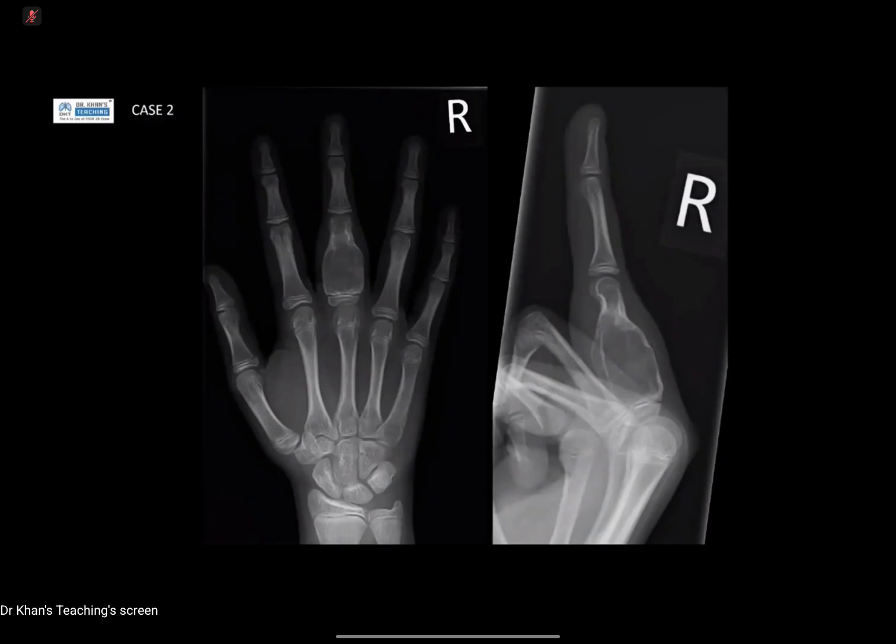Okay. So I would agree doing an MR would be helpful if the patient were having symptoms. Enchondromas are fairly common. I wouldn't suggest doing an MR for every enchondroma that you see. But that was really well presented, really nice. You would hope that if you were given an exam case like this, the case would have that very typical ring and arc chondroid matrix. So I'm giving you a bit of a tricky one, but you handled that really nicely.